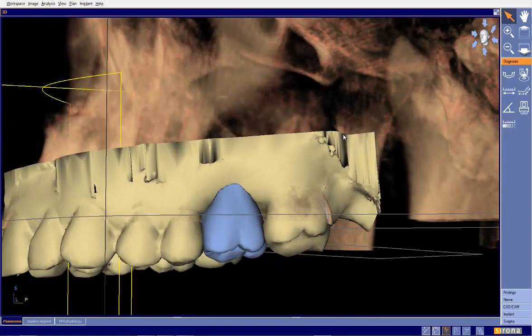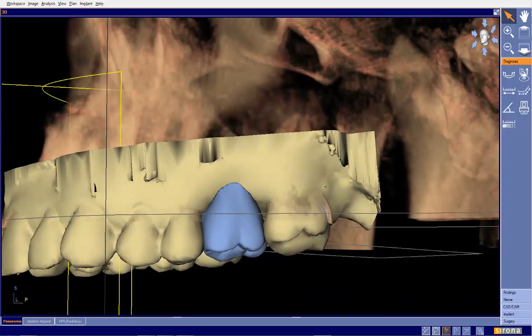The only critique I can make to this is that in an ideal world, when we design our CEREC, I don't know where the tissue is on this one, but it looks like the margin should probably be more, probably to about right here. So remember to draw your circle to about right here, so that we can get a better idea of where the implant is going to come out of the tissue. So it's the only critique I have on that.